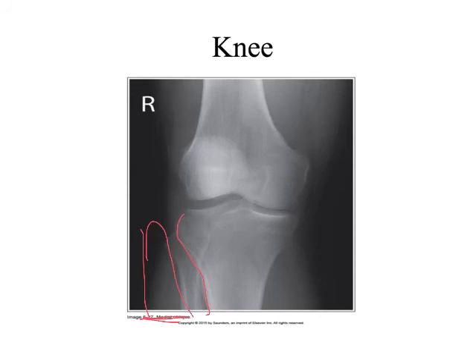Do you think it might just be oblique enough? I think it's still medial, it's oblique, just not oblique enough, because there's no way that's a lateral. Look at the other ones, there were lateral obliques, because one was the left and one was the right. It's possible it's just not obliqued enough. But it's strange to me that the kneecap is where it's at. Yeah, I think you're right. I do think this is a medial oblique because we have the patella right here. It's just not obliqued enough.